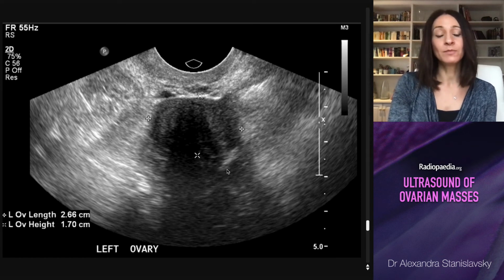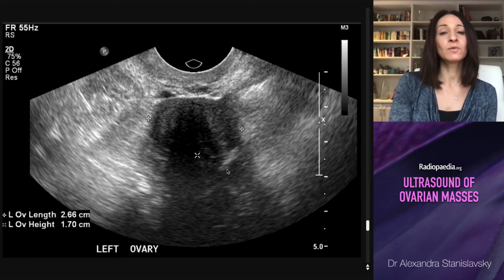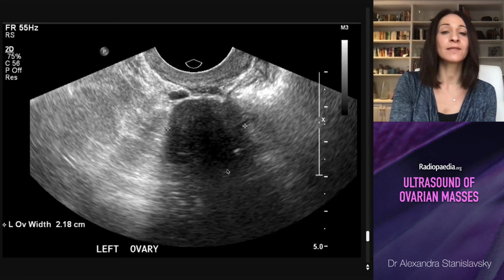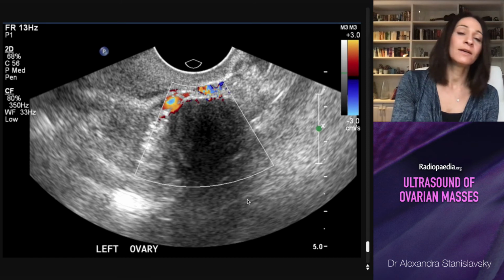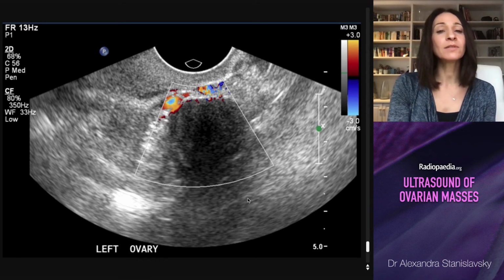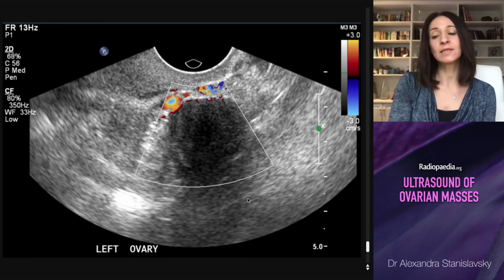Fibromas look like fibroids. Okay, fibromas are typically small, well-circumscribed masses with acoustic shadowing, and when we see an adnexal mass which is small, solid, and it has acoustic shadowing, and it's regular, and it's got no internal vascularity, we are very glad, because we can be quite reassuring. We still would send this patient to a gynecologist generally for review.